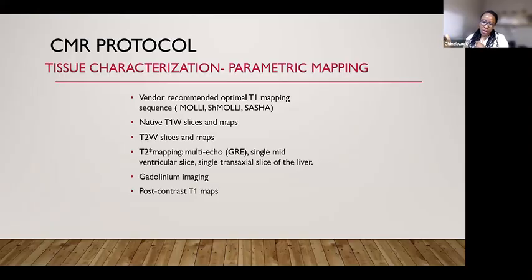And then at the time point where myocardium should have washed out, which is our late gadolinium imaging, we would expect normal myocardium to be black, because it's washed out and the myocardium is back to being nulled. But we would expect unhealthy myocardium, or myocardium that has lots of scar in it, to still be white. Now, it may not just be scar, there may be other substances that also expand extracellular space, but essentially, we expect areas of expanded extracellular space to still have gadolinium hanging around at that late time point imaging.